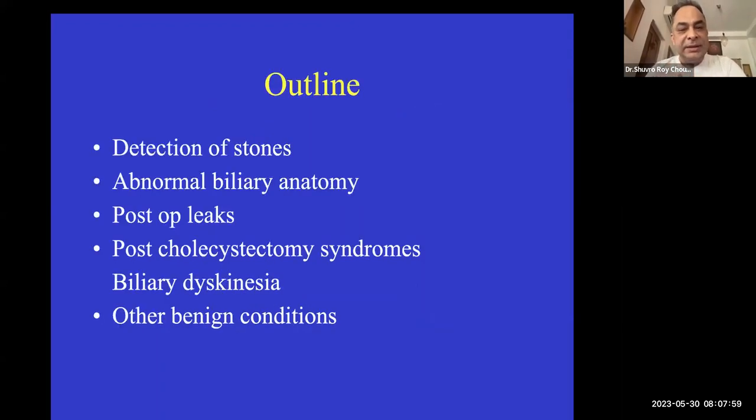In this talk, I'm going to talk a little bit about detection of biliary stones, abnormal biliary anatomy, postoperative leaks, post-cholecystectomy syndromes, biliary dyskinesia, and some other benign biliary conditions. So this is not about malignancy.